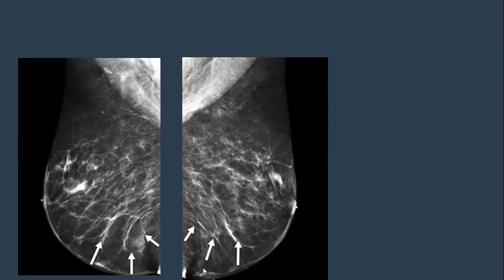This is skin thickening going down and irregular due to scarring. The scar is usually from the nipple inferiorly, and look at the nipple pointing up, not like the normal. You see, the breast is lifted up. These are the clues for bilateral mammoplasty.